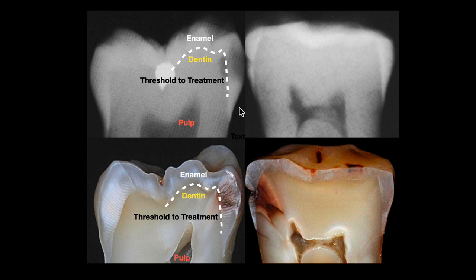So taking a look at the x-rays, most people have actually seen their own x-rays. What I notice first is how large the shadow is here. The shadow represents how deep the cavity is. When we take a look at the tooth on the bottom, we can see that there is a very dark discoloration in the tooth. It's very noticeably different than the rest of the tooth, where over here we can see that the enamel is very, very bright, very white as well. And on the inside, it's a little tinge of yellow, which is the dentin.